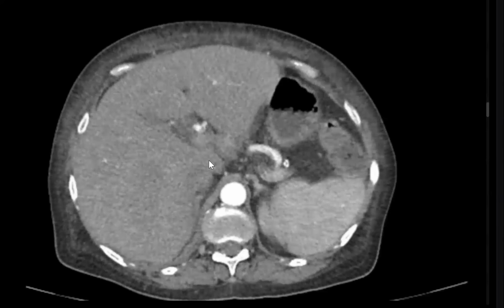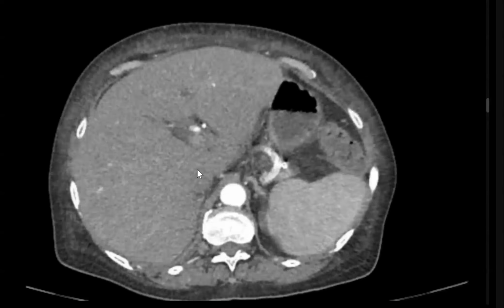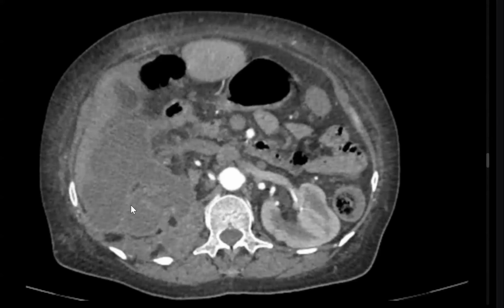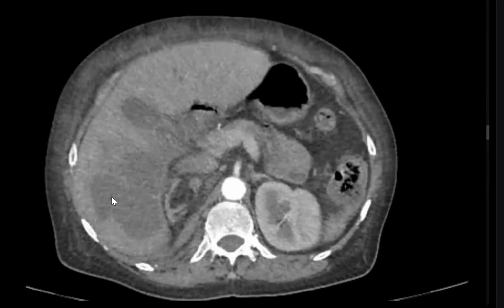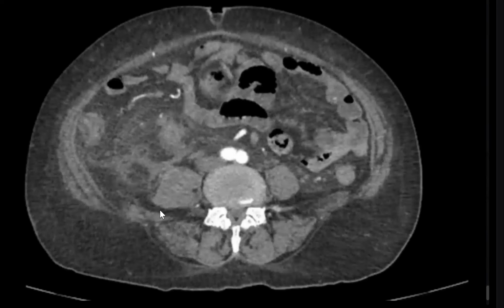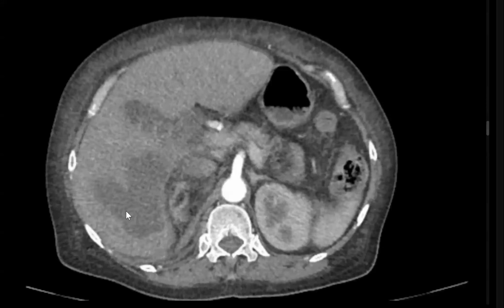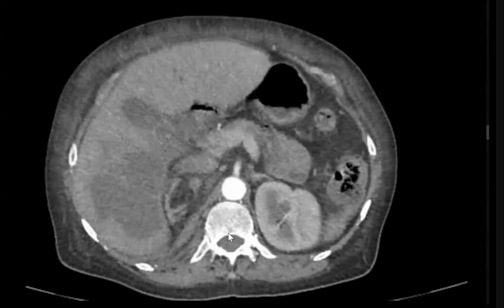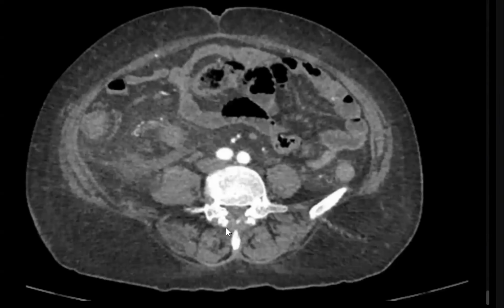It's arterial phase actually. There are some areas of hypoenhancement occupying most of the right lobe of the liver. You forget the most important and basic rule. In my routine practice, I check from the first till the last cut. Because where is the kidney? Where is the right kidney?